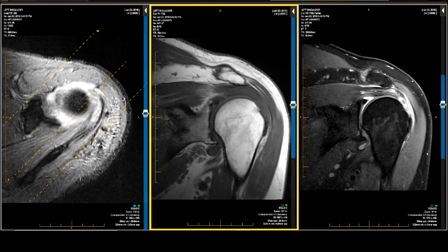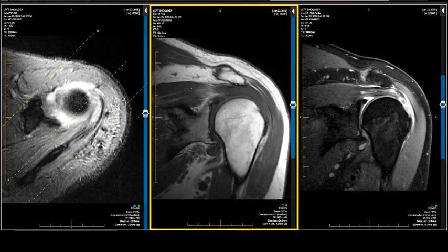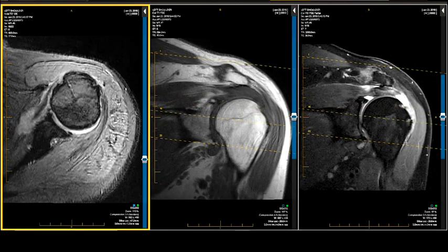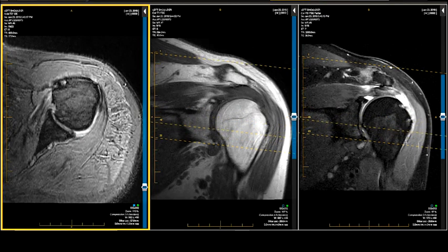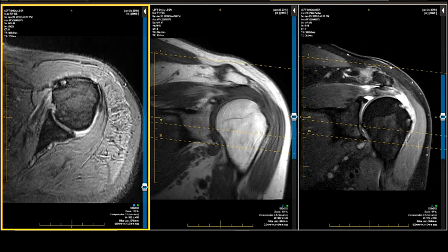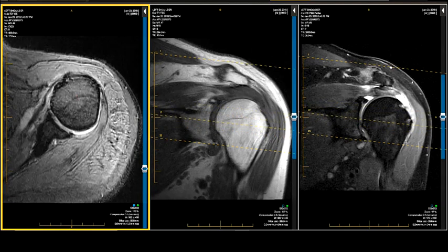It is atrophy, but it's volumetric atrophy, not that much fatty replacement. There's fatty replacement at the myotendinous junction. Let's keep working our way down. Some glenohumeral arthropathy, degenerative changes and chronic tearing in the posterior labrum. Honestly, most people have something like that.